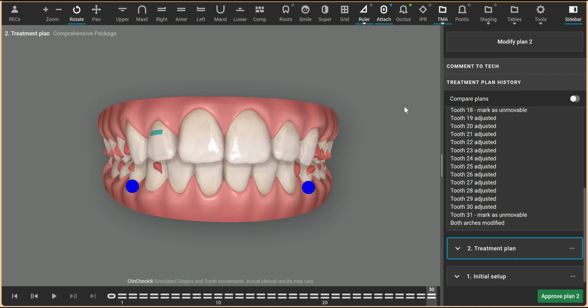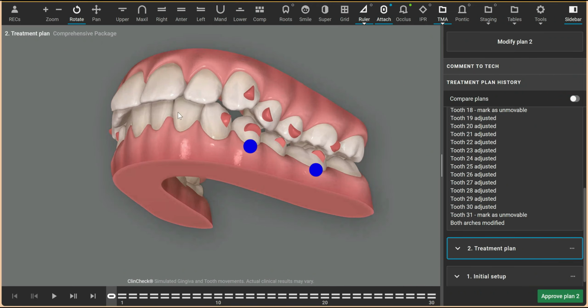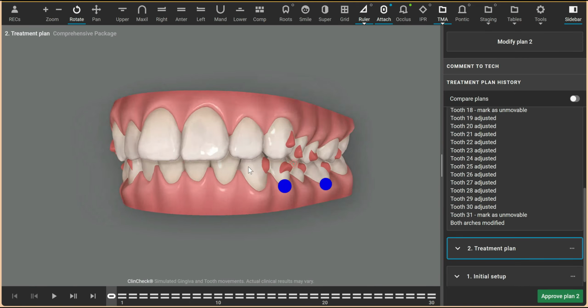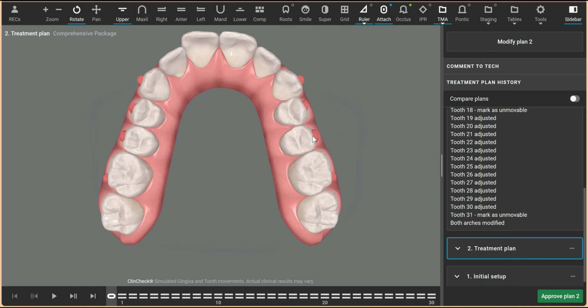This is a female patient. She's 30 years old and she wants her teeth aligned. So let's go back. This is where she's at to begin with. She probably doesn't like the fact that her central incisors are sticking out here. She's not coming in and saying that she wants her arches developed, but she probably does realize that she has a dominant cuspid to cuspid smile in the upper because she has omega form and the premolar teeth are tipped lingual, and they really don't show much. So she wants Invisalign.